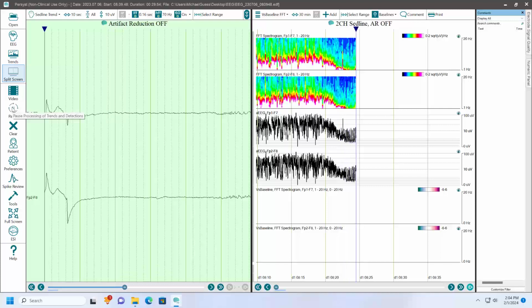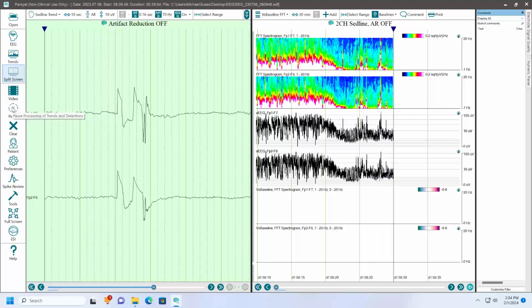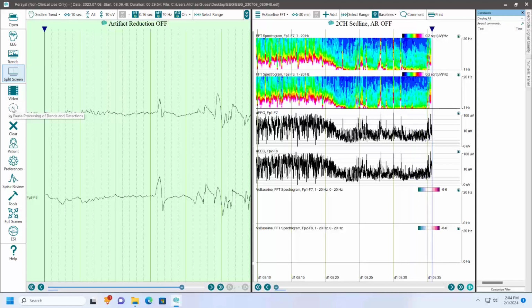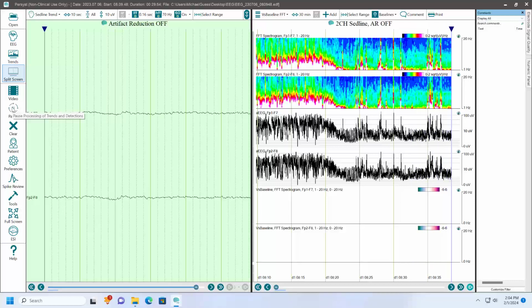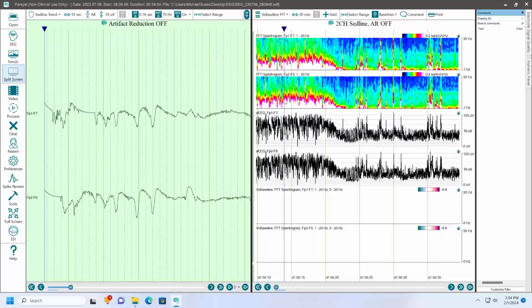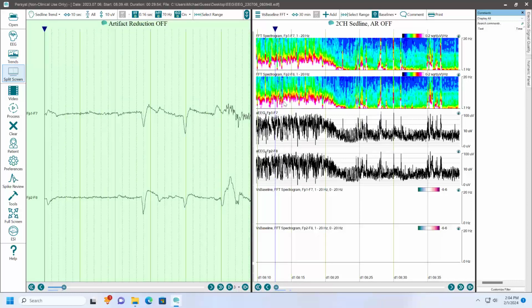Now the versus baseline trends are blank. It's not going to set an automatic baseline in this case, and that's okay. We're going to set one manually. The automatic baseline is set with 1020 recordings, where it can look at is there sufficient electrode quality? Well, we're not doing electrode quality because we have a subset of channels. And we're not going to do chewing artifact or look for seizures. Those are all things that the automatic baseline will use to determine a good place to set that. We're going to go ahead and just pick, I suppose, this initial part of the record, which looks like it has some artifact, but this will give us a good idea of what's happening.